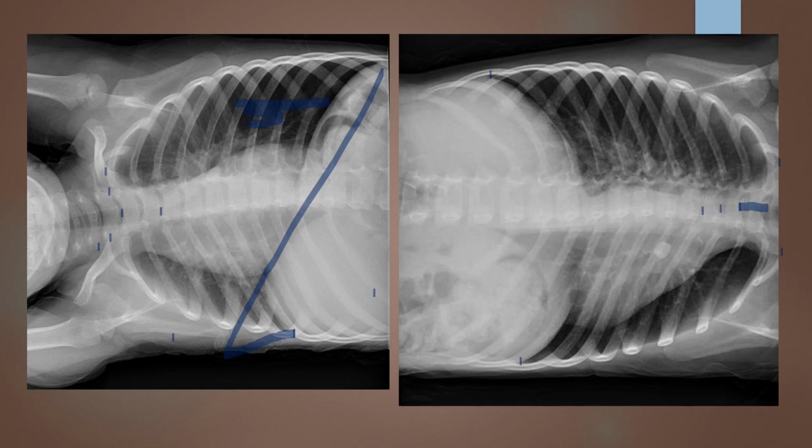So my manubrium is high. The clavicles are also high, which would indicate that the superior aspect of my patient was tilted back towards the IR. Because of that tilting, I would probably go ahead and repeat both of these images because you're seeing the same issue over on this side. When I did that, I'd obviously move my IR on this image up. I'd increase my kVp, I would decrease my mAs, and I would reposition for this image.